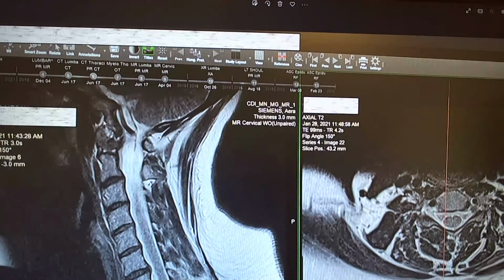If you have a pannus, it's suggestive of what kind of disease? Rheumatoid arthritis. Okay. Remember, a thick area around C1, C2 may be a good indicator that you are dealing with degenerative changes related to rheumatoid arthritis.